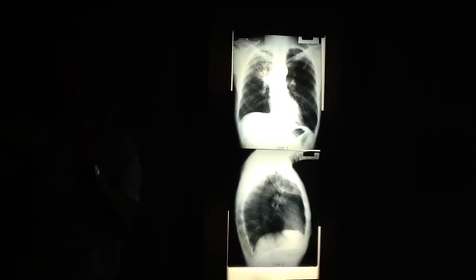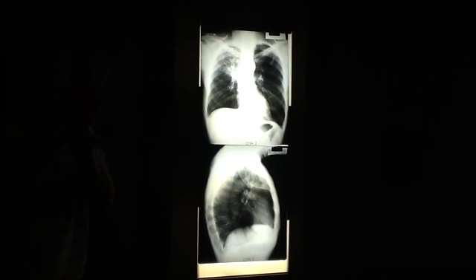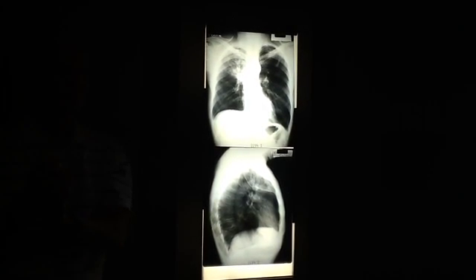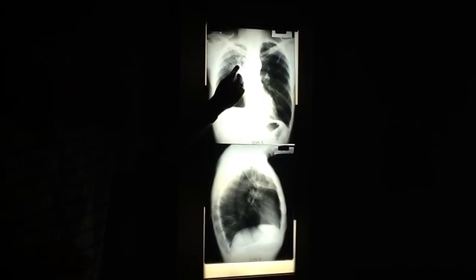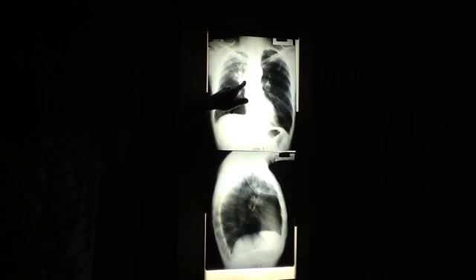It becomes more water density. And what does it do? Silhouettes the blood vessels eventually. So you're going to shrink them, they're going to get closer and closer together, but what's in between them is increasing in density, and eventually you can't see them anymore. So vascular crowding is a very early sign. Now, diaphragm's up, hilus is up, all going toward the increase in density.